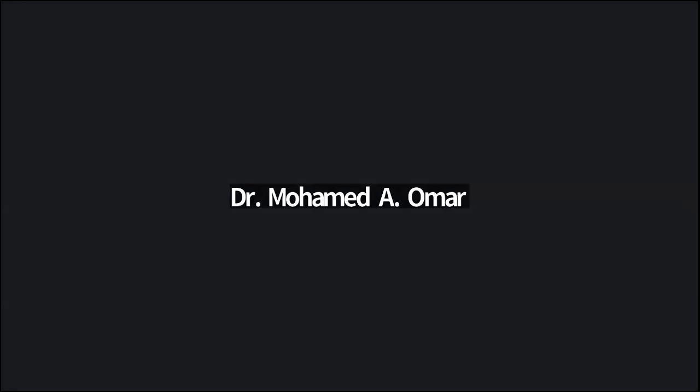The trick again, especially for those of you I know we have met in the ward, is for each patient, just pick one scan, look at it, try to engage yourself, look at what particular scan it is. Is it a T1? Is it a T1 with contrast? Ask your colleague, see if they agree with you. Defend your points on why you think it's a T1. Your colleague can defend why they think it's a T2. And you'll see within a week or two, the more you look at the scans, I promise you, you'll be able to make head and tail out of it. Then go through and read the clinical correlation of what you're seeing on the patient and whether it makes sense. Thank you very much.